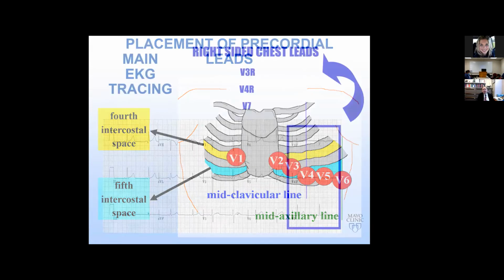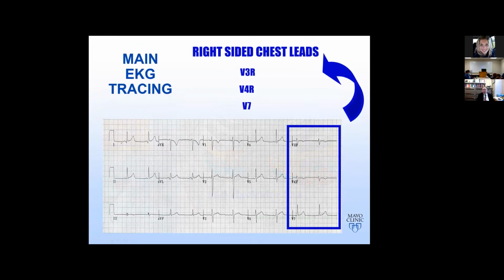Well, then what's special about a pediatric EKG? Because if you look at pediatric ECGs, it's definitely different than reading an adult ECG. With adult ECGs, the criteria are pretty much universal from about 20 years up to 80 years. But in pediatrics, because there are so many changes and transitions that happen with the heart, there are age-specific findings. And there are findings in pediatrics that we don't typically see in adults.